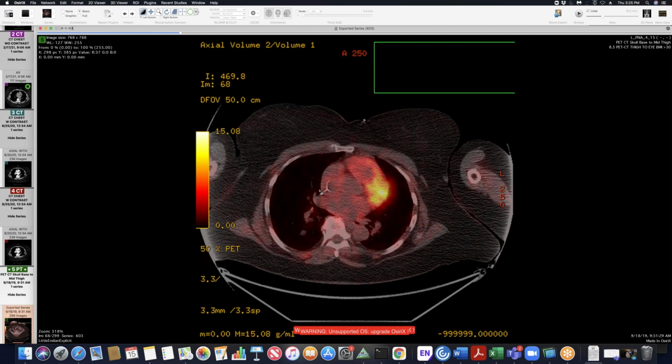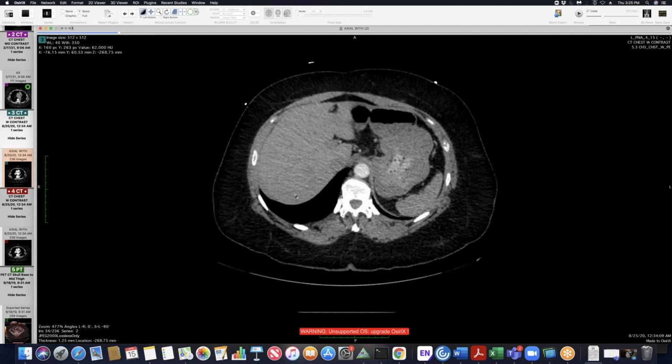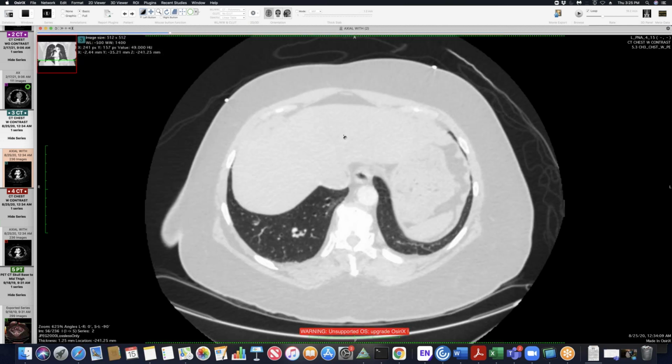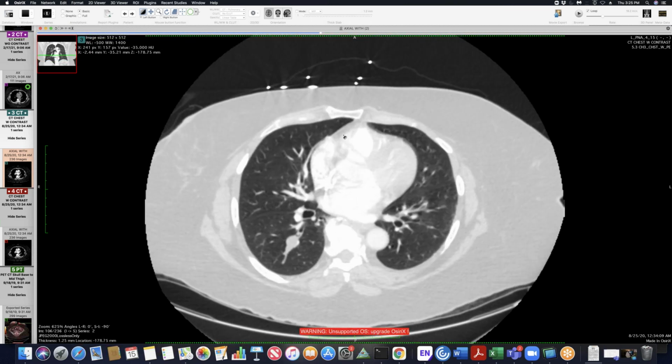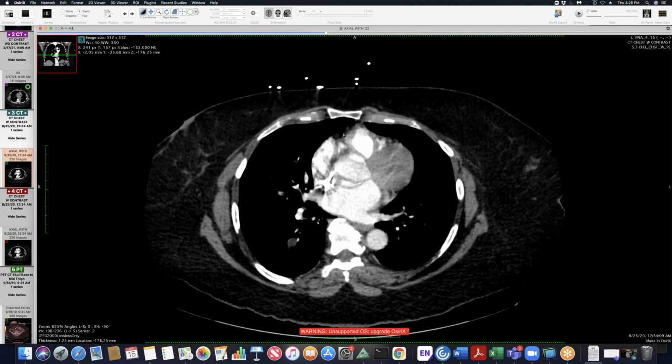That's a hamartoma, bronchial hamartoma. Was that a consideration given bronchial hamartoma? That makes sense, but then I checked. I don't have it, but I checked like 2 or 3 years back, and it wasn't there. So the thing is, they can grow, but I'd be a little surprised for something aspirated being as discrete as this thing is, being just a nodule and not more spread out, the way aspirated things tend to be. What do you guys think about that?